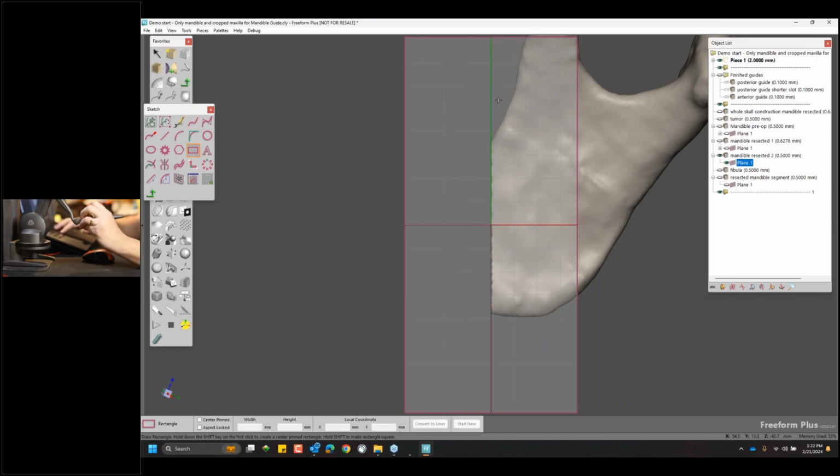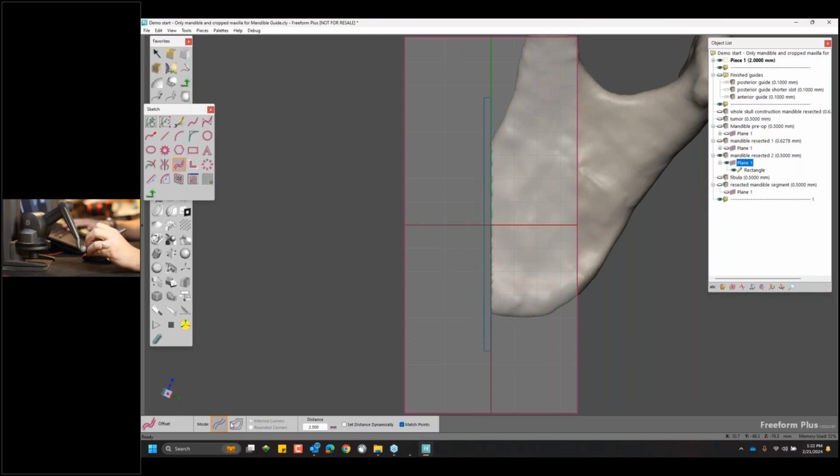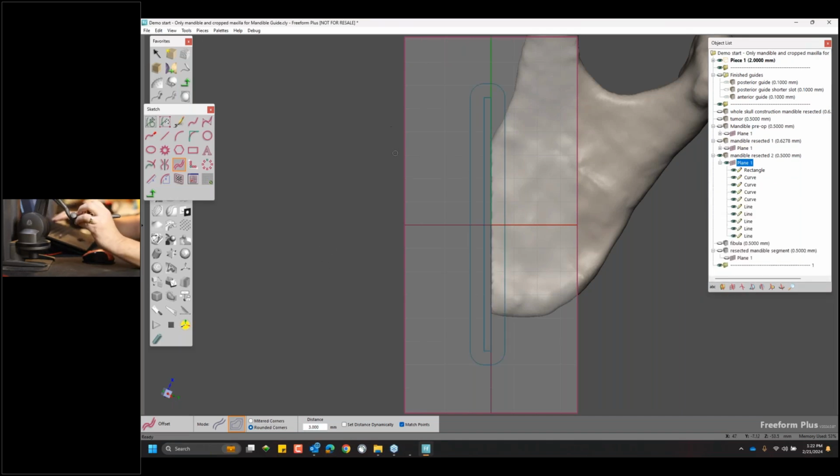Create a cutting slot. So the actual region where the saw blade is going to go. I'll start above and go down below, giving clearance on either side, and pick my width of 1.5 millimeters. And then I will offset this in order to create the plastic or the material that's going to be around this, automatically round the corners, and offset that to the outside. Actually, I want to do that at 3 millimeters. Make it just a little bit stronger.